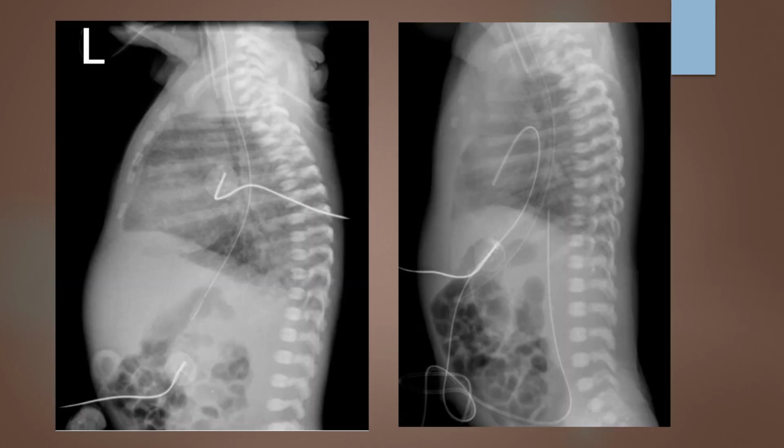So taking a look here at our lateral chest, this says it is a left lateral. It's just hung as a right, or displayed as a right. So we're going to first look at our anatomy. Do I have apex to diaphragm, or apex to costophrenic angle, back to apex? So we have the anatomy there. We're a little bit excessive on the anatomy. That tells us our collimation should have been brought up somewhat.